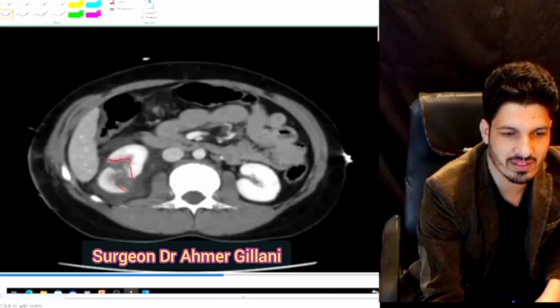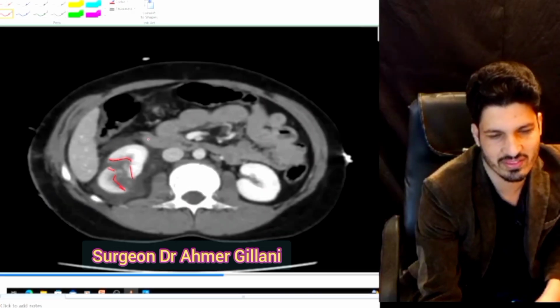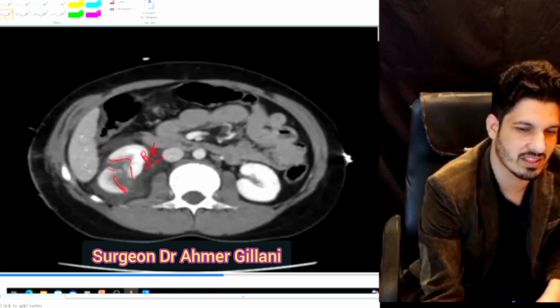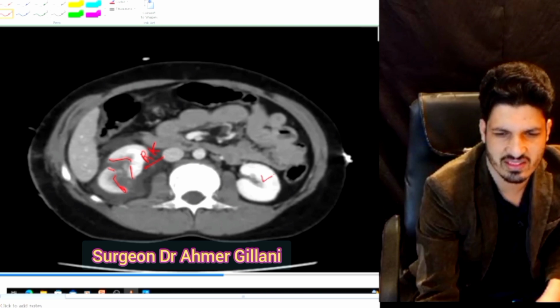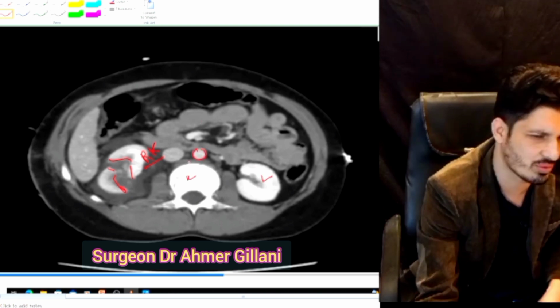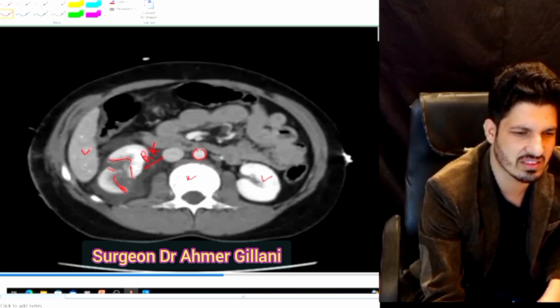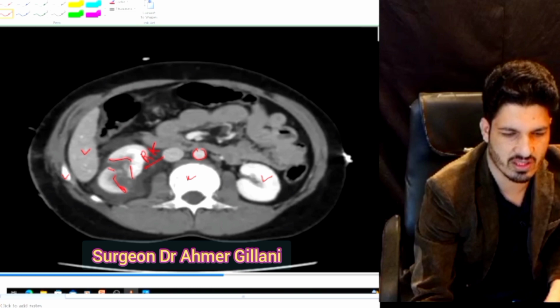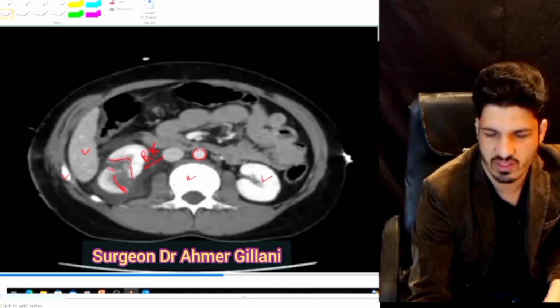In this CT scan you can easily clearly identify that spot, and this is definitely right kidney in this CT scan, while this kidney is normal, this is vertebra, this is aorta, and all the structures you can identify easily. This is liver, these are ribs, so no need to mention. I already explained in an elaborative way.